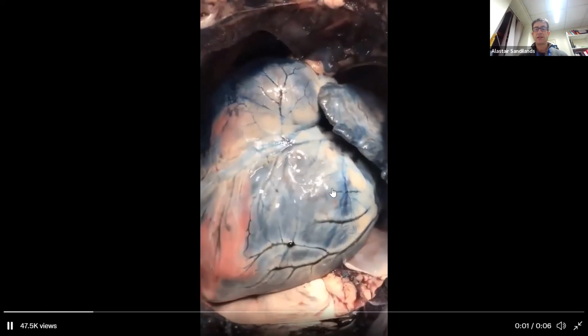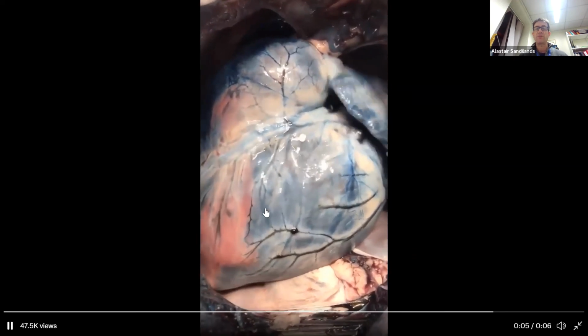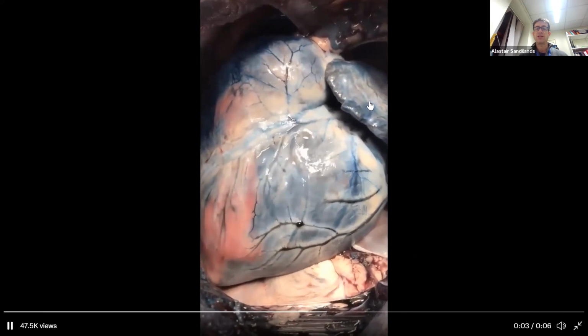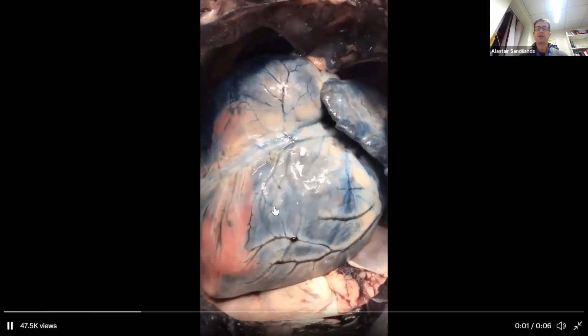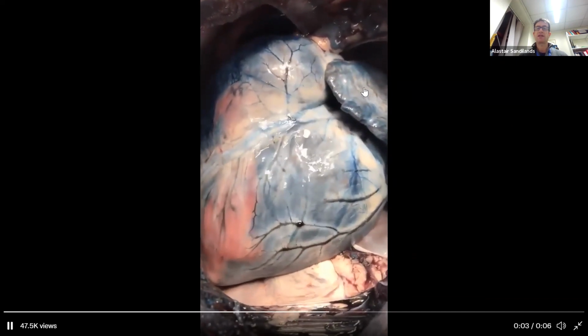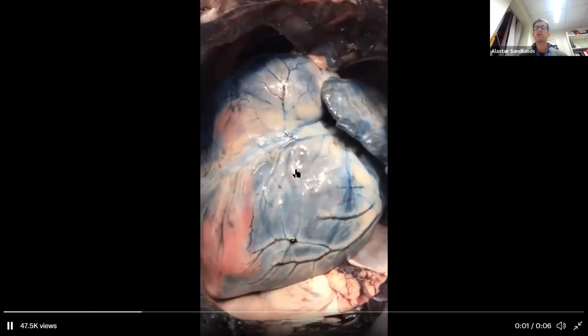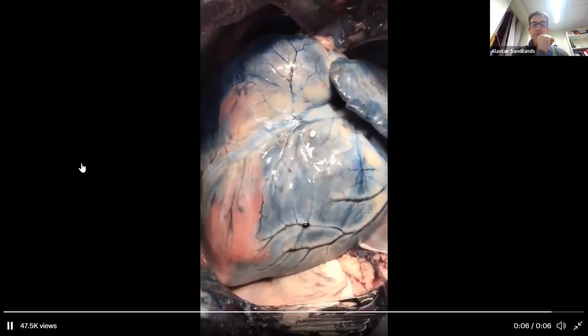And there's the atrium, and there's the sinus node beating at a completely different rate to the ventricle. You see that? So this is VT, this is sinus at a different rate. So it's dissociated. This is fast. There's no relationship between the V and the A. Any questions on that?